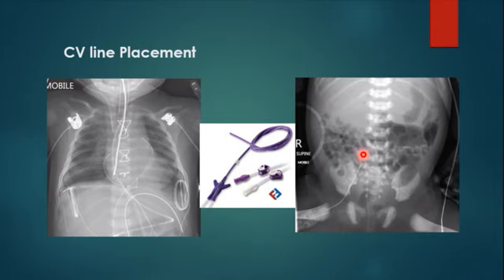The important thing is that the tip of this should be reaching the superior vena cava, or at least the cavo-atrial junction, touching the atrium. Not too deep, not too high.